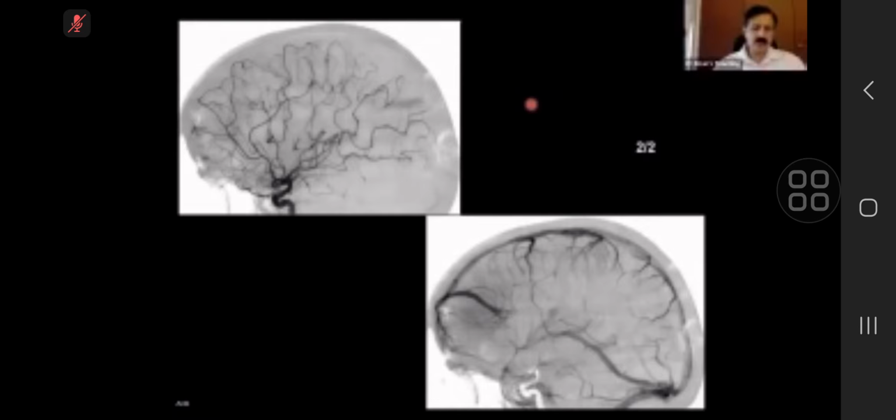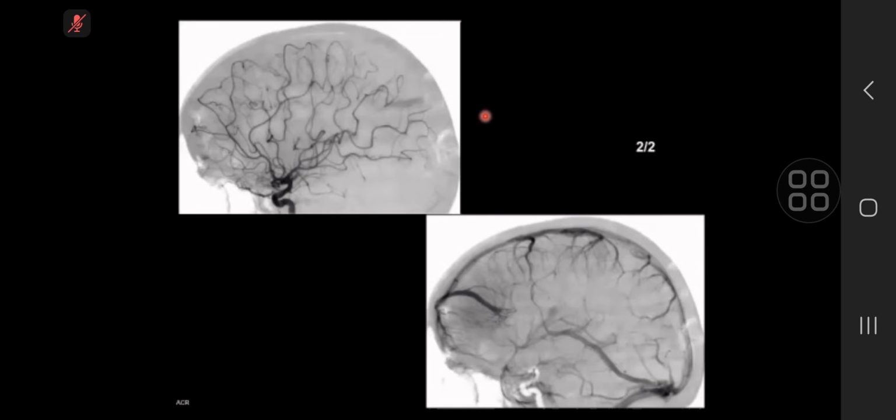So I've given you an angiogram of the same case, and you have an arterial phase and a venous phase. Over to you. Okay, so on the venous phase, it almost looks like what I was looking at on the CT. It appears to be in the right frontal region, and I can't appreciate that area on the arterial phase, but on the venous phase, just below the superior sagittal sinus, I can see a well-defined linear structure. Whether this is a cortical vessel, an aberrant vessel.